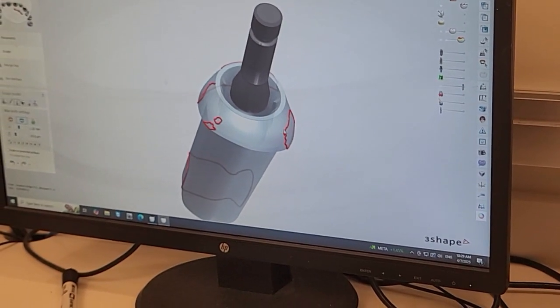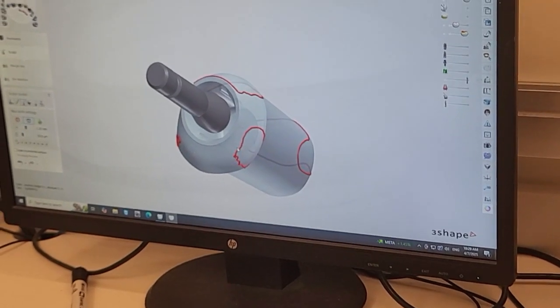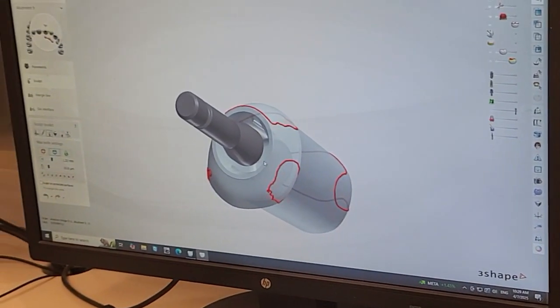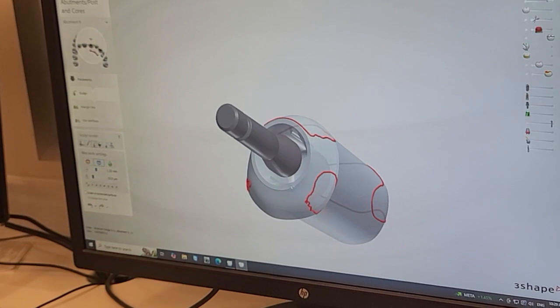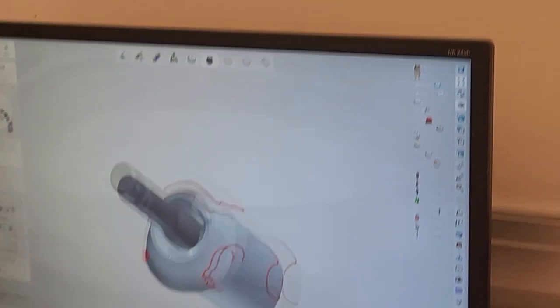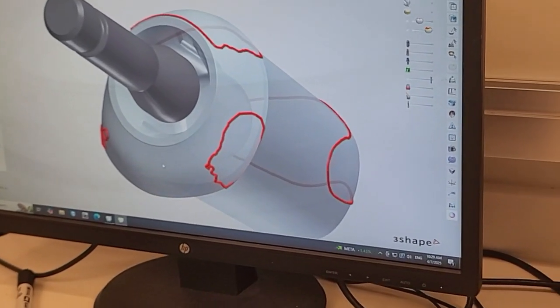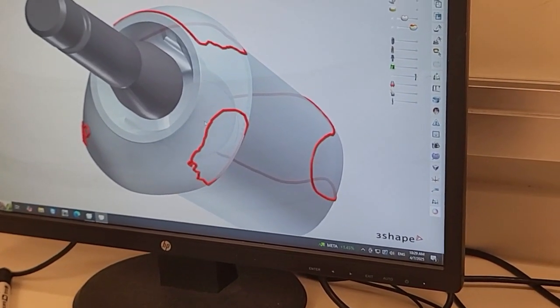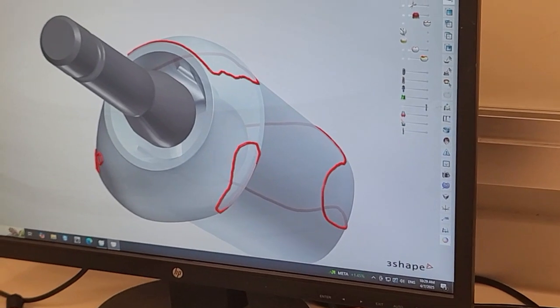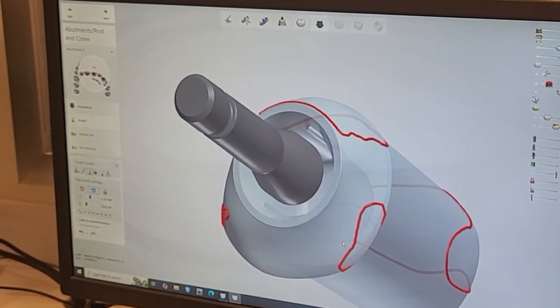You do it by hand now with your models, and if you look at it, I keep clicking and nothing happens, right? Why? Because the software protects this area. So if I click sculpt, now it's going to allow me to do it. See it? It didn't allow me before. If I click this, it doesn't allow me to do anything, okay?